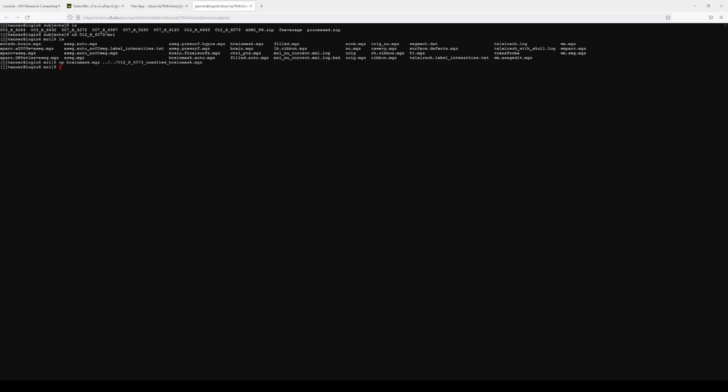You don't have to do that for this assignment. Just saying in general, if you're going to edit these and you want to make sure that you have the unedited version, you want a copy of that, so you can make a copy of it, put it somewhere. I gave it a name, and then again, if I decided, oh, I don't like the edits that I made to this brain mask, let's get rid of the edited one, put the unedited one back in there, and I could do the same thing. I could copy that file into this current directory, but I would just save it as brainmask.mgz instead of this new name.